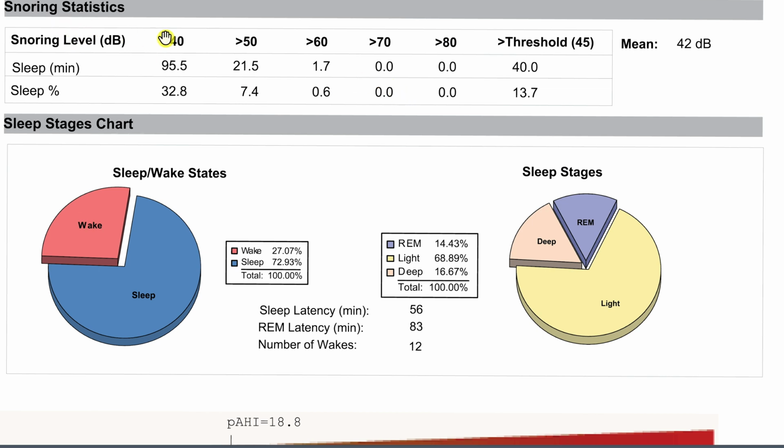But just to do you guys the service and go over this properly, snoring level is in decibels, which is just a measurement of sound. I'm not going to get into that.